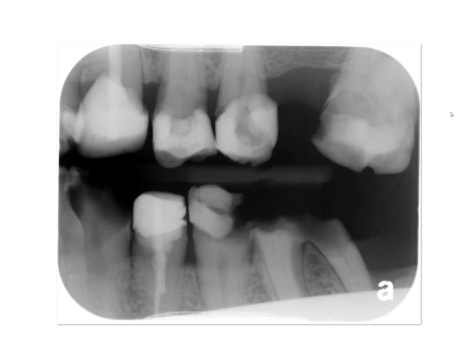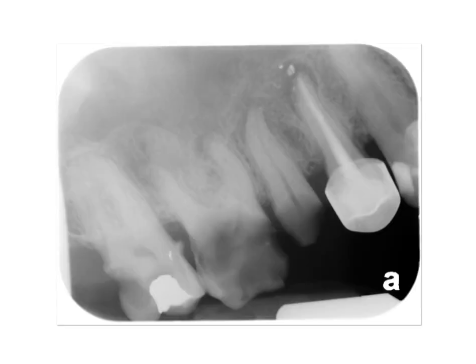So here we have a bite-wing radiograph, obviously a patient with lots of restoration and caries. I'll just point out anything that I see. Here's an example of a cone cut. Also, along the edge of the phosphor plate there is an artifact, which is consistent with deterioration of the material or the degradation of the phosphor plate itself. Let's go to the next one.